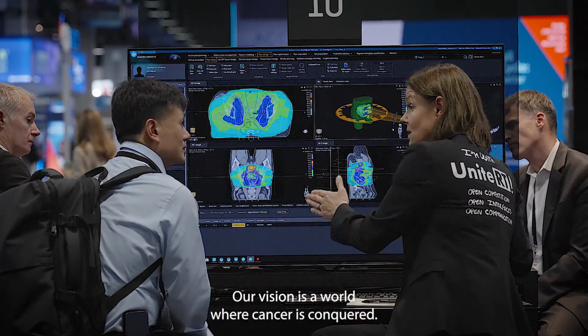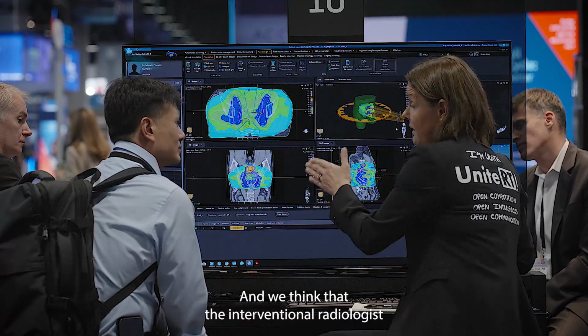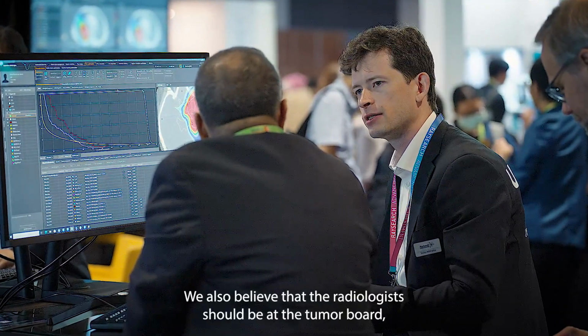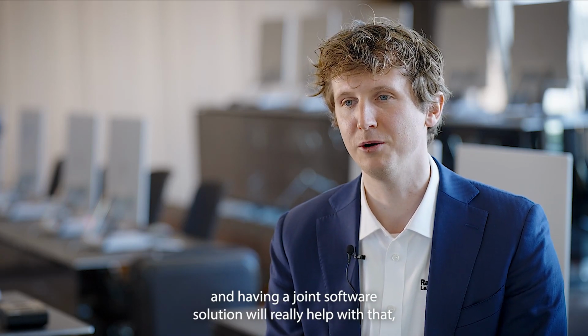Our vision is a world where cancer is conquered, and we think that the interventional radiologist really plays an important role in that and should be part of that journey. We also believe that the radiologist should be at the tumor board, and having a joint software solution will really help with that, we think.